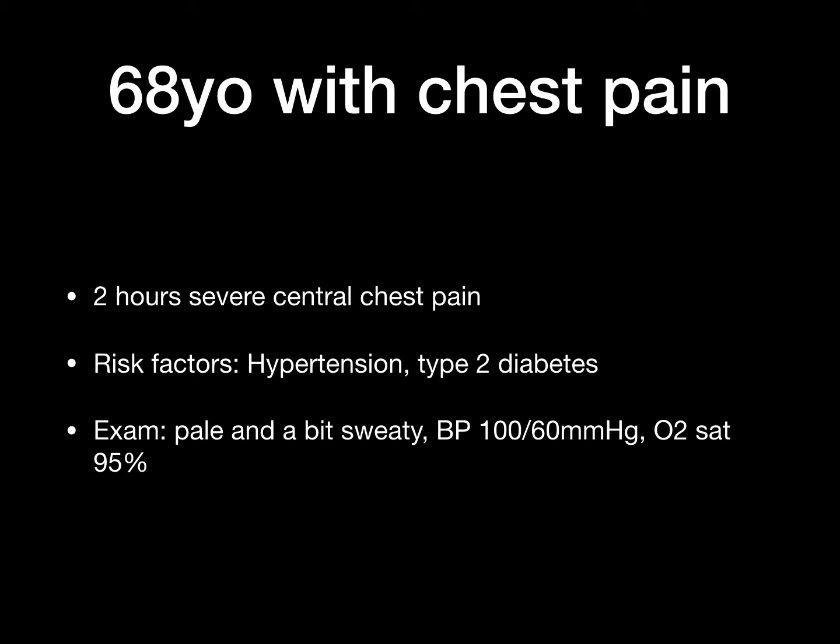So in this scenario, we would assume that this is an ST elevation myocardial infarct equivalent based on the left bundle branch block ECG. And usually these patients are quite sick, become quite unstable, and to cause a left bundle branch block usually need quite a large infarct, which usually involves the left anterior descending artery or anterior myocardial wall.